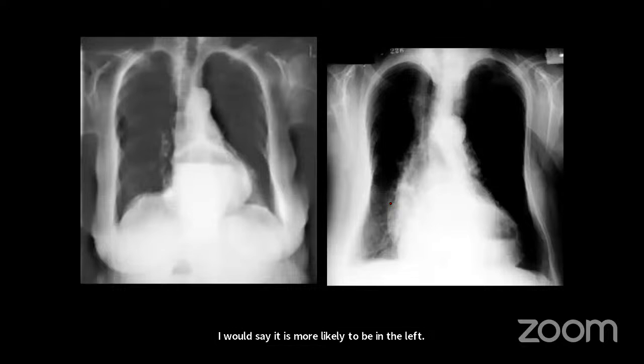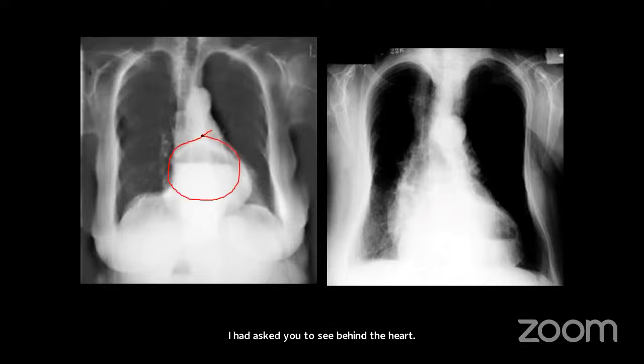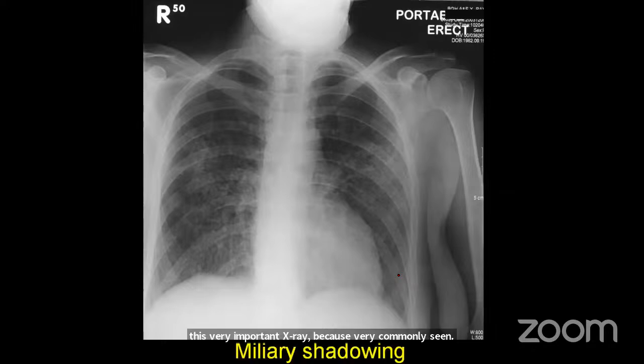Then we have an X-ray here. Directly we feel that there is nothing much, but if you see properly, I had asked you to see behind the heart. Behind the heart, there is an air fluid level. So this is actually a hiatus hernia. You can see here there is possibly a diaphragmatic hiatus hernia, where the stomach is also herniated upwards. Okay. Now this is a very important X-ray because it is very commonly seen. These are actually miliary shadows, which can happen most commonly in tuberculosis, but can also happen in occupational lung disease, pneumoconiosis.